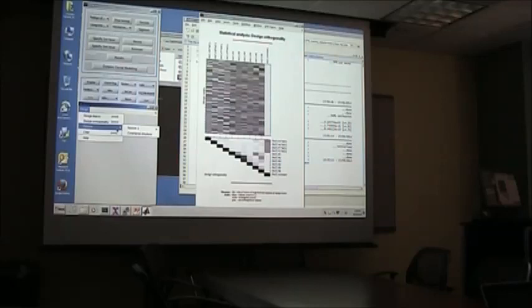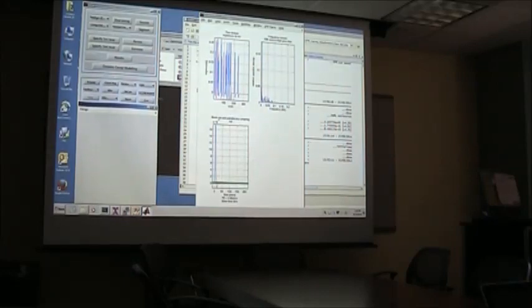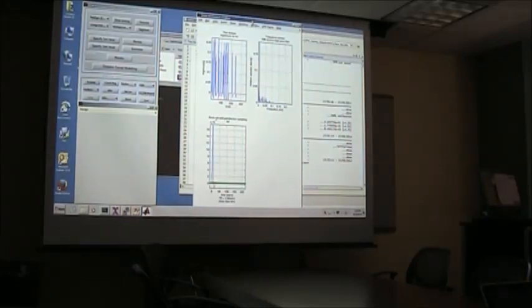Another thing is to go to explore, and then you can go through each of the factors in your data. It's not super clear, but SPM will show the cutoff frequency here, basically the frequency representation of your signal of interest and where the cutoff frequency was.